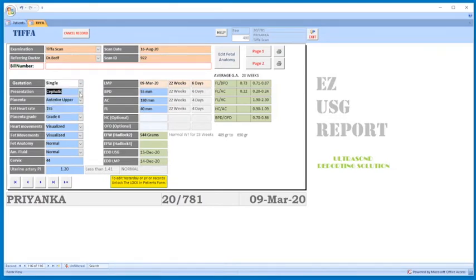Presentation. Now select placental location. Heart rate. Placental grade. Heart movements, and fetal movements. Fetal anatomy. Select C remarks if abnormal. Amniotic fluid. Length of cervix. Uterine artery PI if you want. Then enter BPD, AC and femur length measurements.